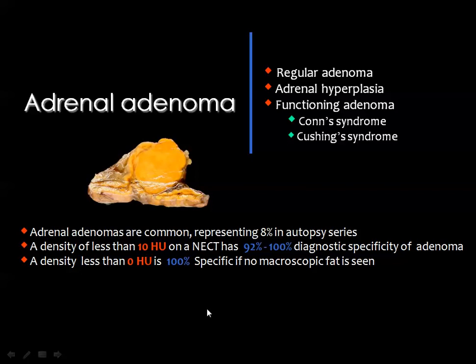Then it is stated in the literature, in order to be sure that you are diagnosing a lipid-rich adenoma, a density less than 10 Hounsfield unit on the pre-contrast CT images has a diagnostic specificity reaching about 100%.